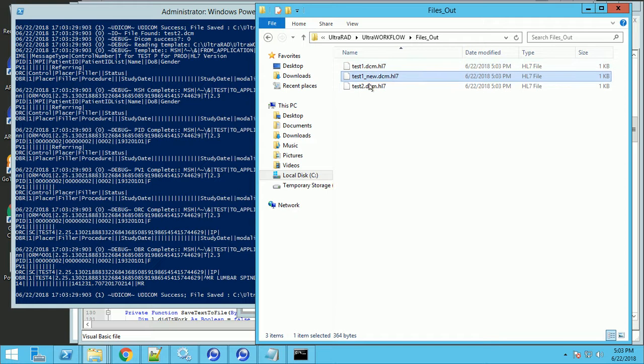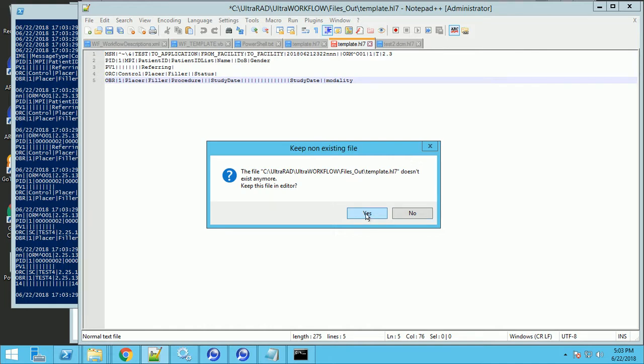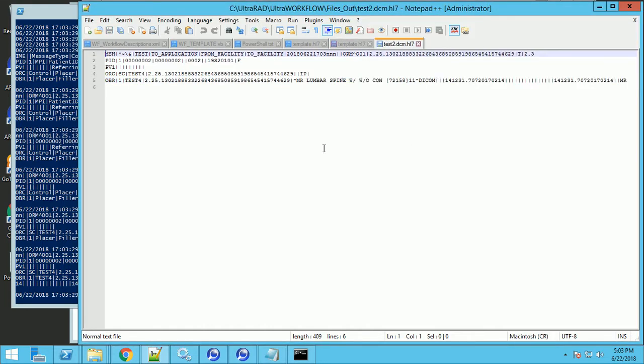So here we have an HL7 message for each one of these files. So for example, in test 2, here it is. Now we have a pretty normal looking HL7 message, right? Except for this NNN on the end. I used the wrong syntax for that, but you could certainly look up the syntax to get the correct date timestamp. It should include the milliseconds down to a thousandth of a second, which would be 3 digits, right? So that's it. That outputted our HL7 message.